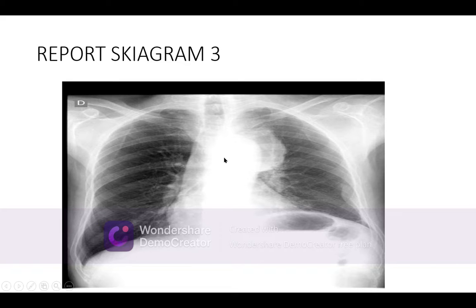Although it may be differentiated from other tumors in the anterior or superior mediastinum, any tumor can arise from here, any type of mesenchymal tumor. Lymphoma is a possibility, but lymph nodes are not present here. I don't want to discuss whether the thymus is enlarged or something like this. Definitely it is enlarged, maybe it is thymoma. I don't know for certain because the biopsy will not be taken. Thymoma. Thymoma is present in this condition.